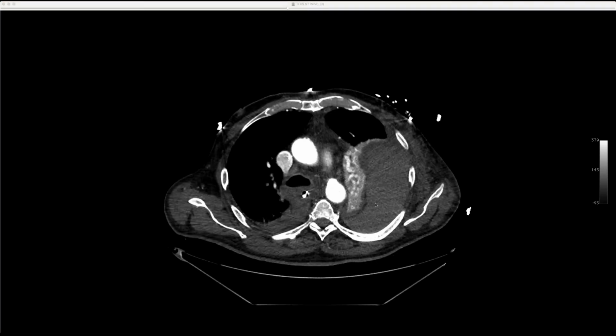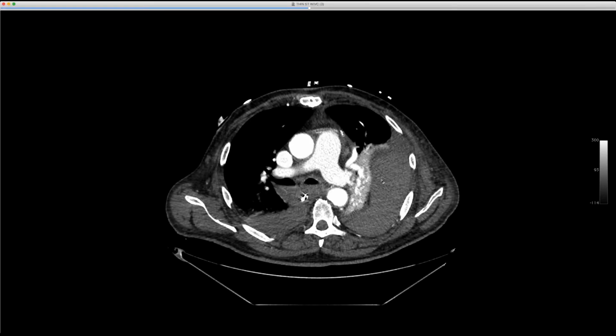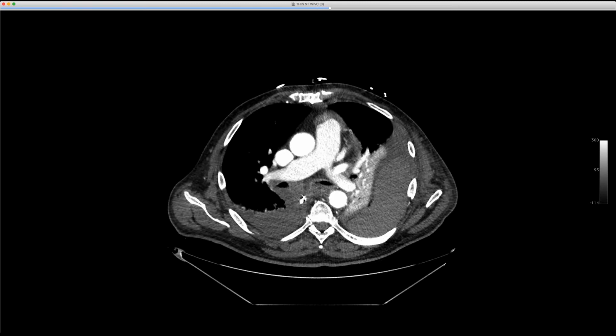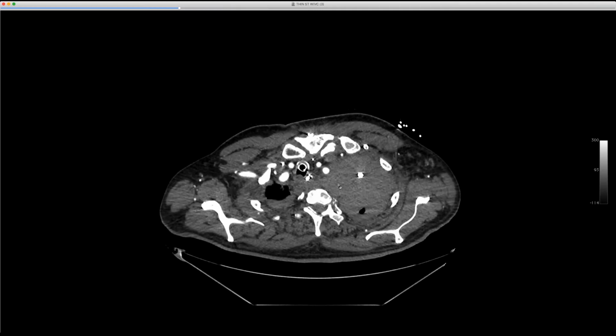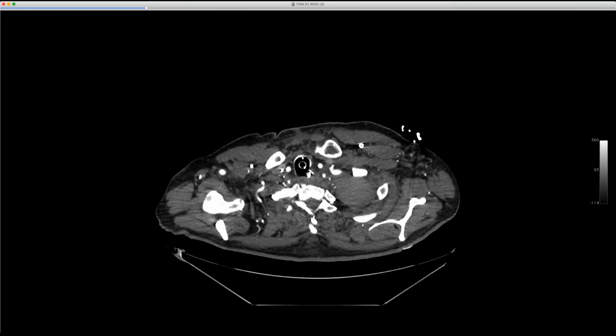I should see this. What's kind of cool is you see the extrapleural hematoma, and then you see extrapleural fat, a little bit of pleural fluid, and then the collapsed lung. So you can really distinguish this from a hemothorax. In this case, you get that fat stripe sign. As far as that upper lobe subclavian thing, we didn't really see the extravasation at this point. There were just the small branch vessels.